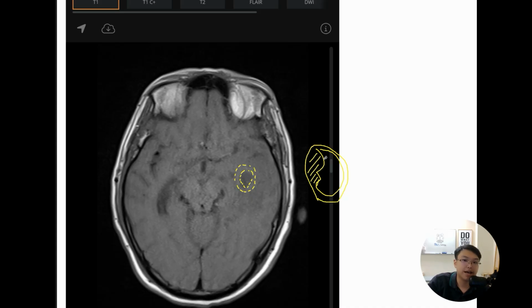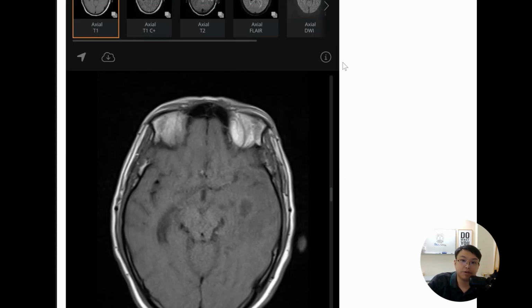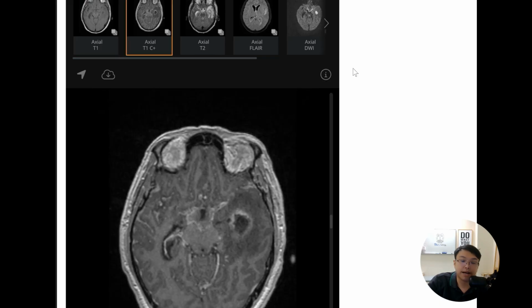Otherwise, you cannot account for the very big difference in the wall thickness, okay, because it is not usual granulation tissue in abscess, okay. But in such a smooth regular wall, okay, both are possible, but at least, okay, neoplasm may not be the final answer. It can still be an abscess, okay. So let me go through another sequence and then we discuss the logic behind, okay.